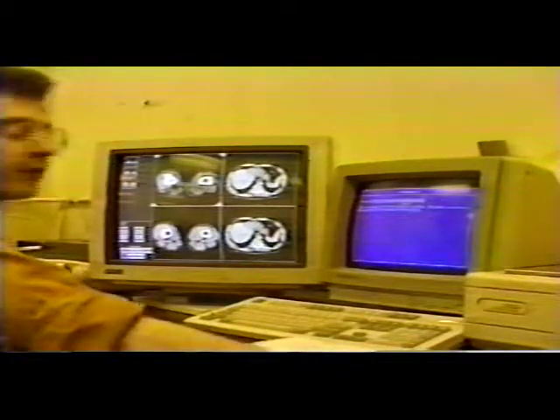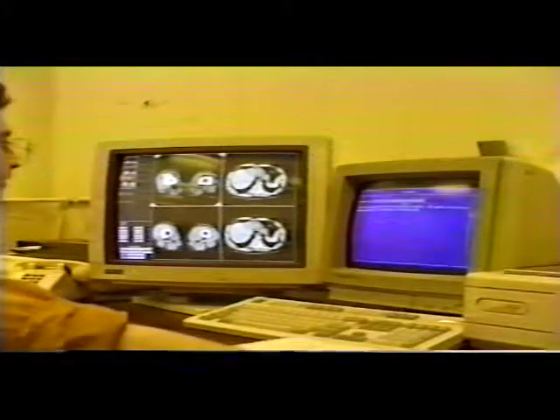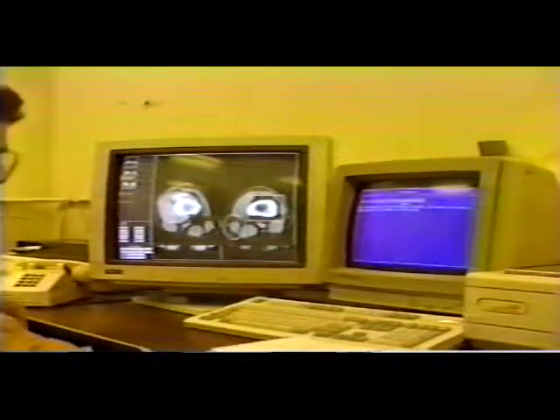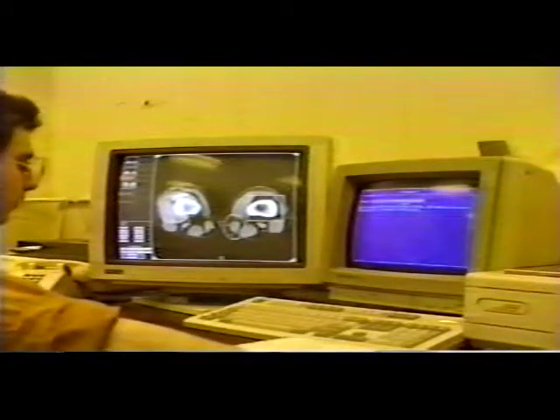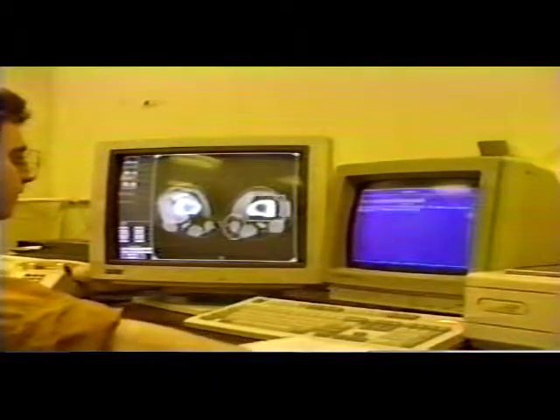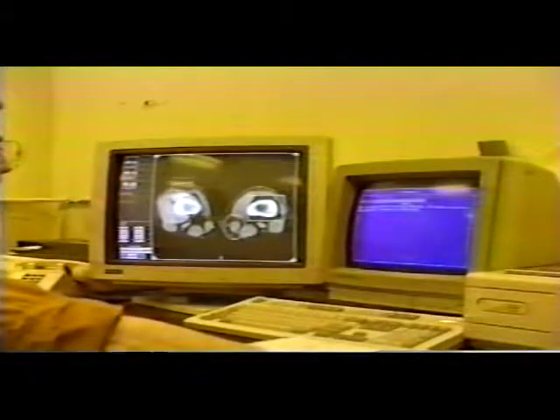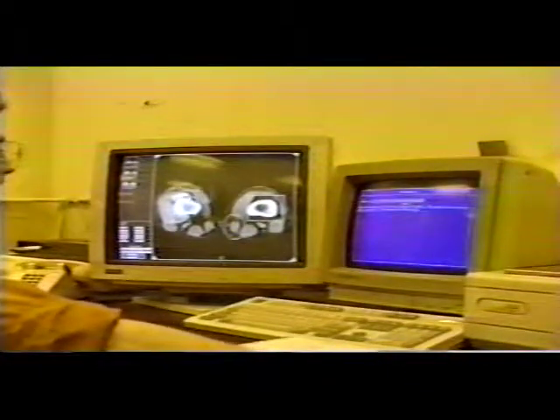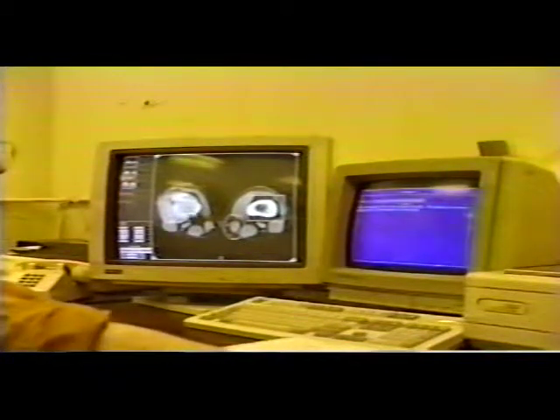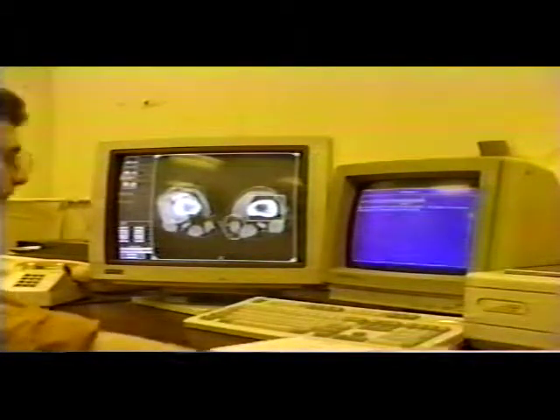Now these circles are drawn as white surrounded by black, so they'll show up no matter what they go on. I can zoom in with this button here, and as I indicated before, there's also a magnifying glass, or a loupe, which can move over any part of the area. Clicking it again gives a higher magnification, and clicking it a third time gives a higher magnification still, with clearly seen pixels. Click it a fourth time and it turns off.